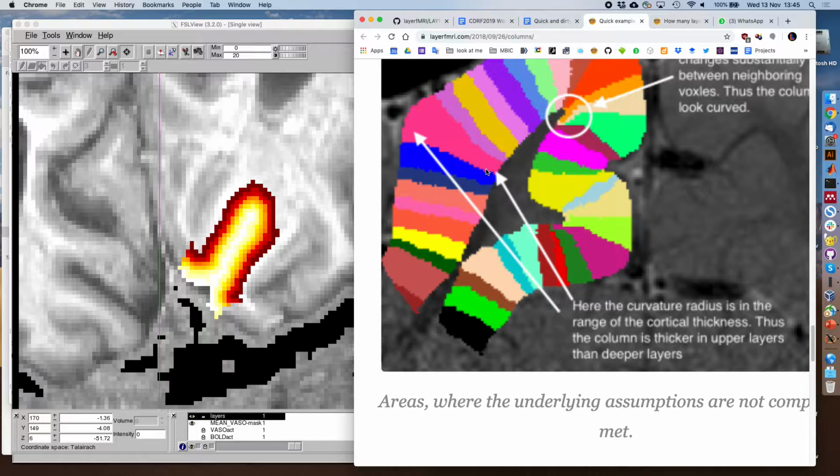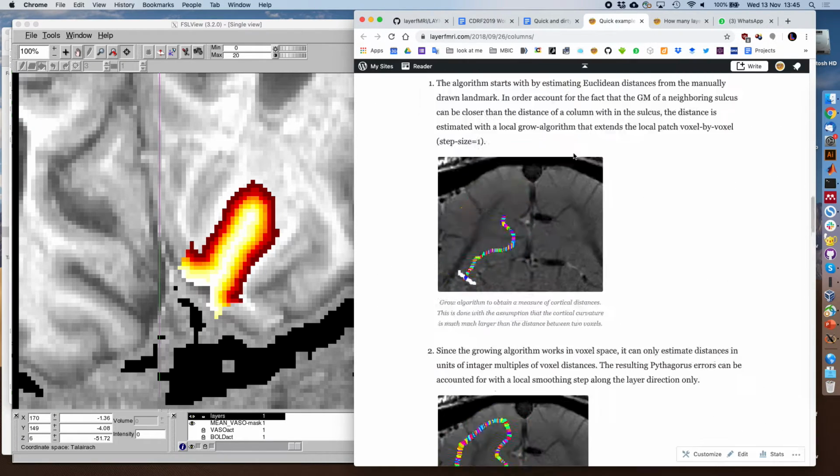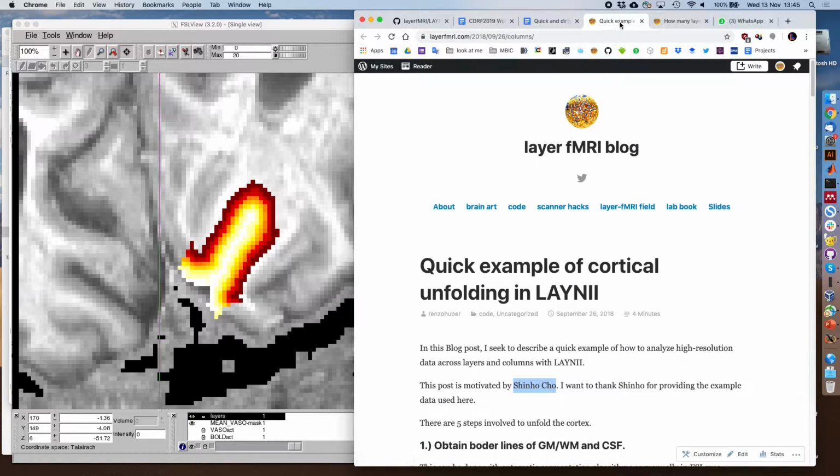So we have certain assumptions of the brain geometry. We need to have them to have a decent working algorithm that's also stable. So if the curvature radius is much smaller than your cortical thickness, then things can get weird, for this algorithm, as for FreeSurfer or any other ones. And maybe you can check out Kendrick Kay's paper on that too, or what Jonathan said yesterday.